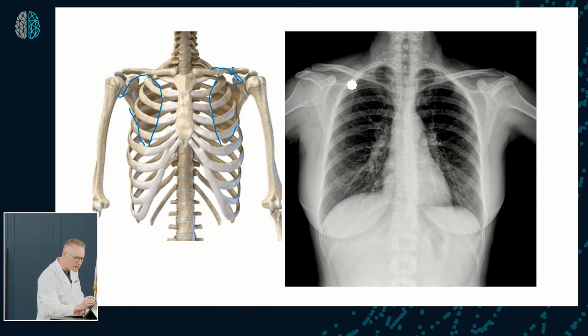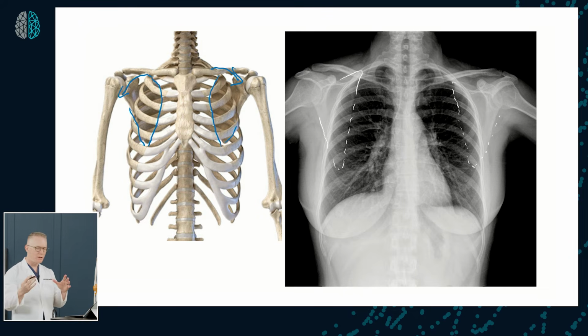So now let's look at the actual chest x-ray of the patient. And again, you can see that the scapula come around and there's a line going down like this, right? There's the scapula. And so with the scapula being in the field of the lungs, the view, that would suggest, even though the patient's arms are a little bit out, they're not fully extended out of the way, that this patient is possibly more of an AP view, okay?